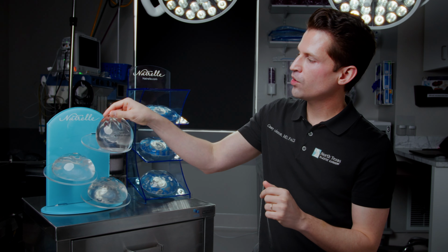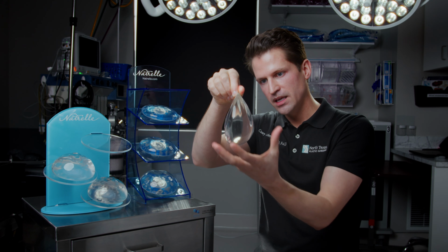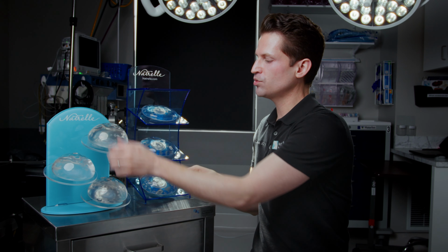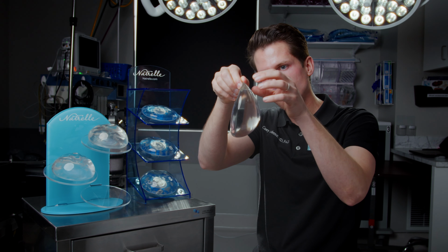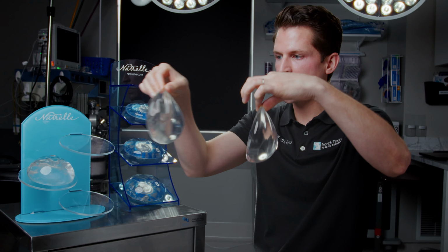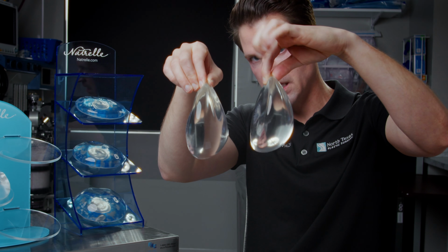So if we go with our softest implant, when I hold it up, you can see from the side that the gel pools at the bottom a little bit. So this is going to give a slightly more natural look than if I do our firmest gel when I hold from the side. Don't worry, I'm going to hold them up at the same time. This holds its shape a little more at the top. So if we want a little more roundness at the top of the breast, this implant's going to help provide for that. So then if we look side by side, we can see a little more natural, a little more augmented looking. So we talked about all that stuff. It was a lot. It's probably confusing. We'll go through it again.